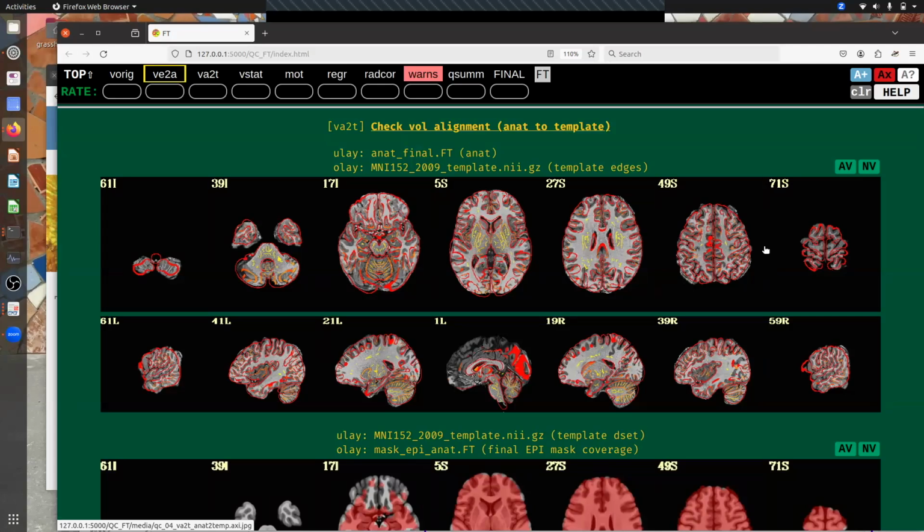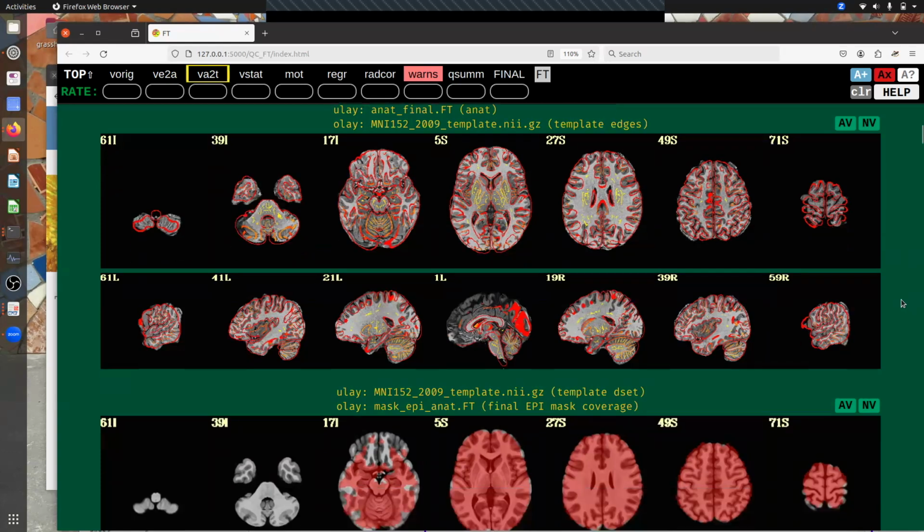Why is that? Actually, this is because this is our in-class teaching example that we want to run very quickly. So this was only a quick, not very detailed alignment to template. So this can and should and would be better in a full analysis. So full marks for skepticism. You don't have to compliment the data just because I'm up here saying this is our data. That's okay. Most people don't, in fact.